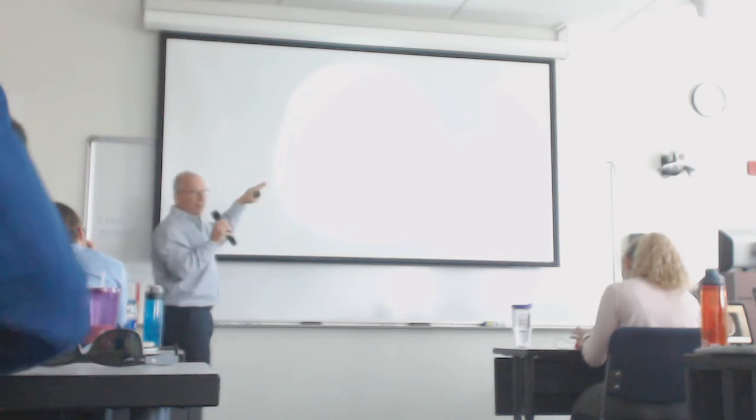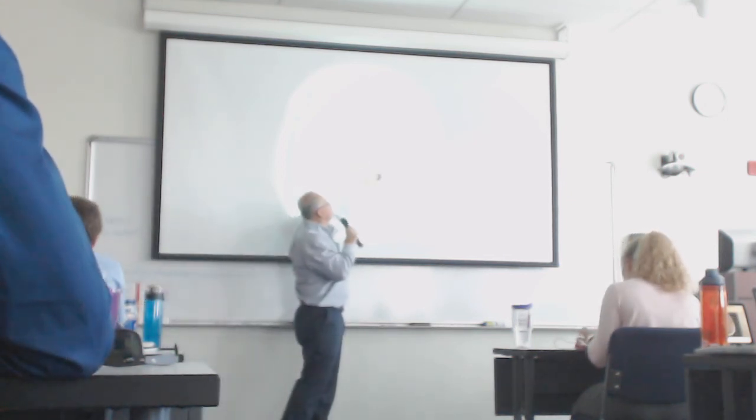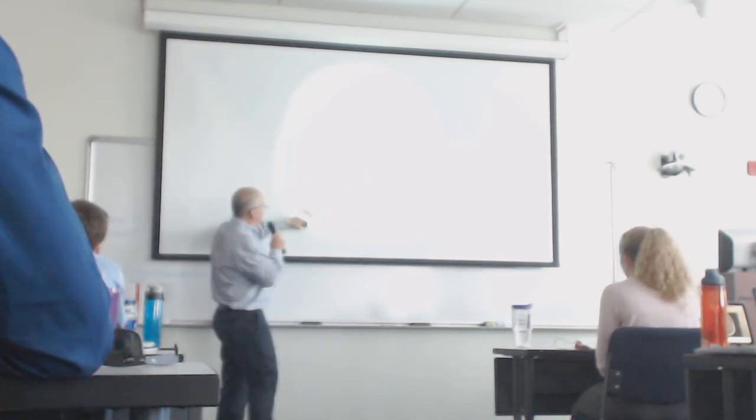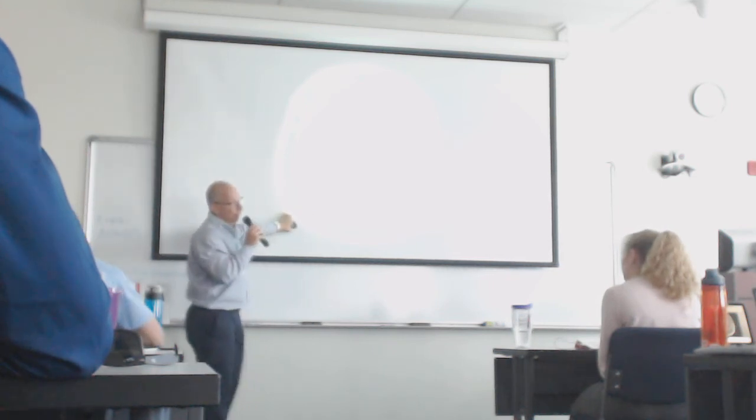Here's a higher up image, T1 weighted MR brain, lateral ventricles that have water in them, black. Brain parenchyma is gray, skull and bone, black. Fat in the scalp, black. I'm sorry, white. White.